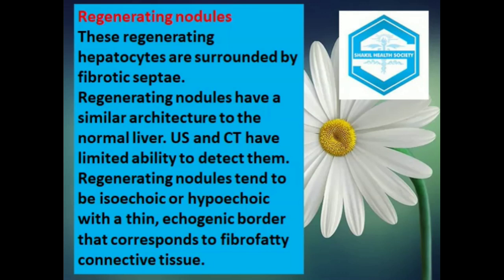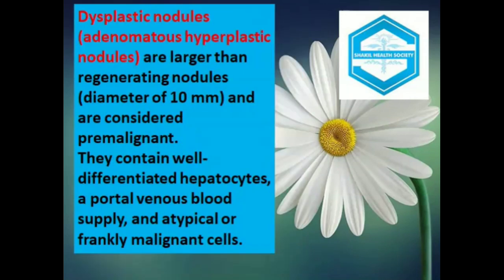Regenerating nodules. These regenerating hepatocytes are surrounded by fibrotic septae. Regenerating nodules have a similar architecture to the normal liver. Ultrasound and CT have limited ability to detect them. Regenerating nodules tend to be isoechoic or hypoechoic with a thin echogenic border that corresponds to fibrofatty connective tissue.